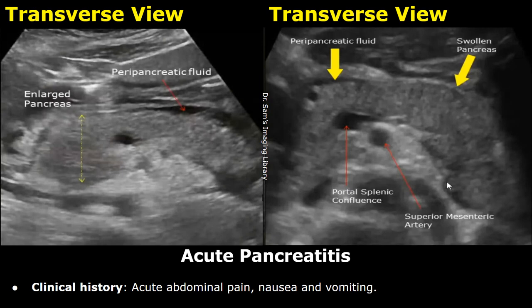This video is about pancreas ultrasound reporting. We will only talk about pancreatic pathologies. This is not a complete abdominal ultrasound report.